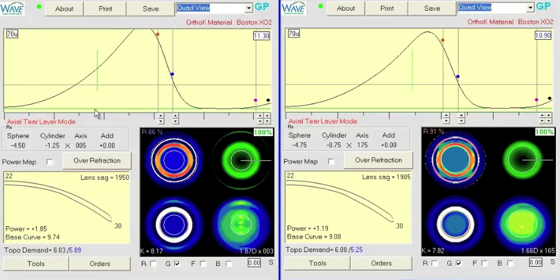So I had initially recommended in this case to possibly decrease the topo demand. In the current case, I wouldn't be opposed to actually increasing the topo demand a little bit and to see if that might help a little bit with the undercorrection in this case. So back to this one, I'm going to bring the original lens back up.